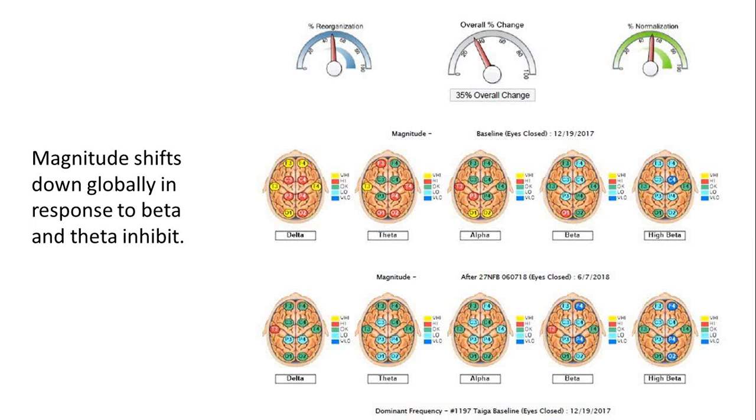So here you're seeing somebody training beta and theta, and all the other frequencies follow. And you can see everything's going down. Now, is that a problem? No. When that delta goes down that far, beta goes down much lower than usual. There's a compensation process there.